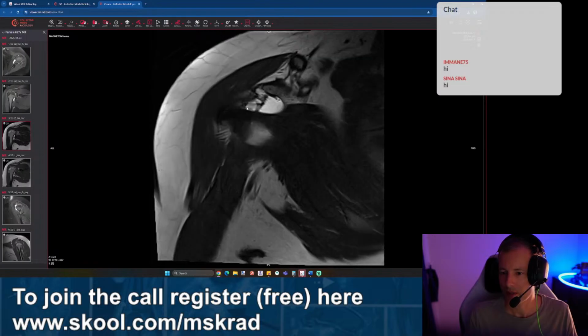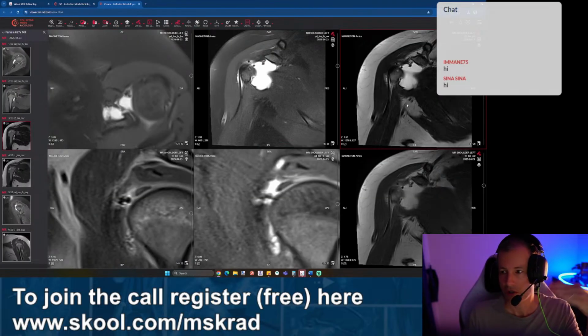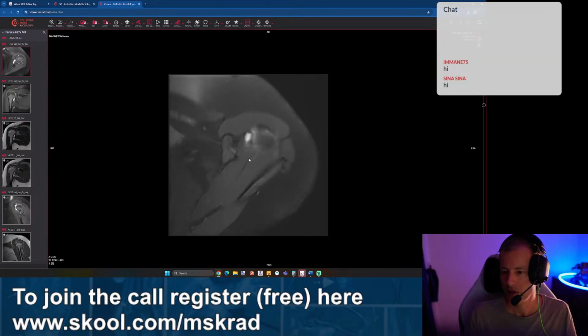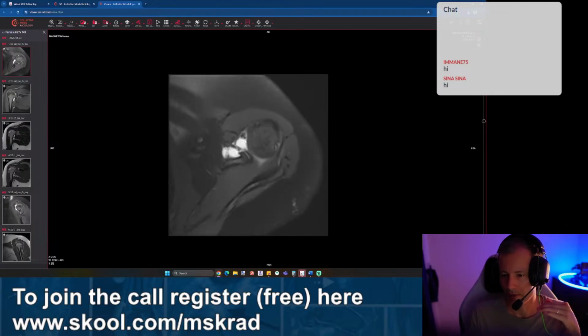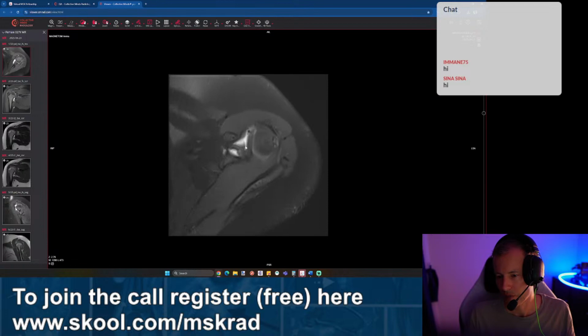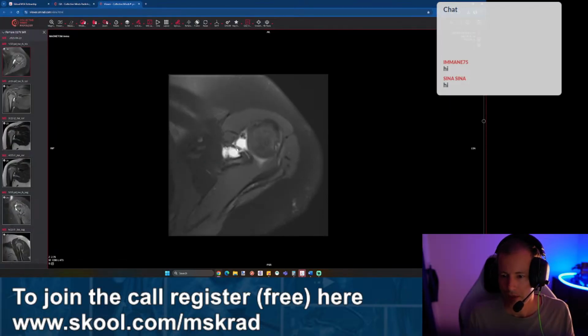We can also see them here, and they typically are at the anti-gravitational direction. So if we have the axial, this is the only axial we got, you would expect them at the very top of it anyways, because air or gas is going against the fluid upwards. So these are two gas bubbles. The other structure would be this one here. It's this one here.